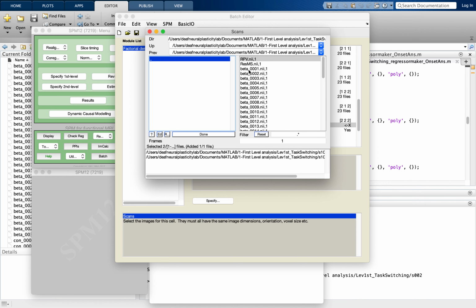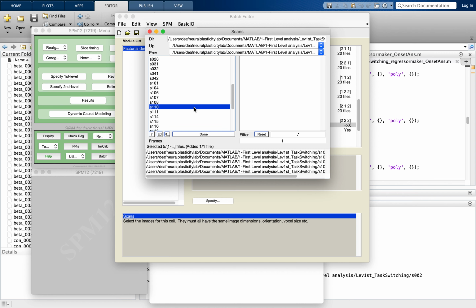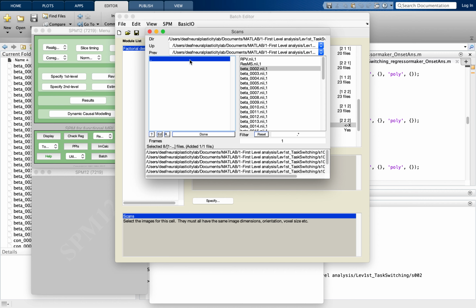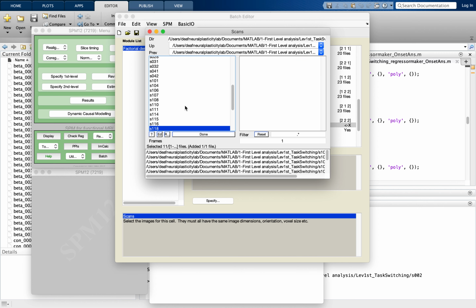And because we have the left and the right, I will show you how to look at the left and right motor activity, which is a good way for you to control that your analysis is done properly, because the response for left and right is very common.